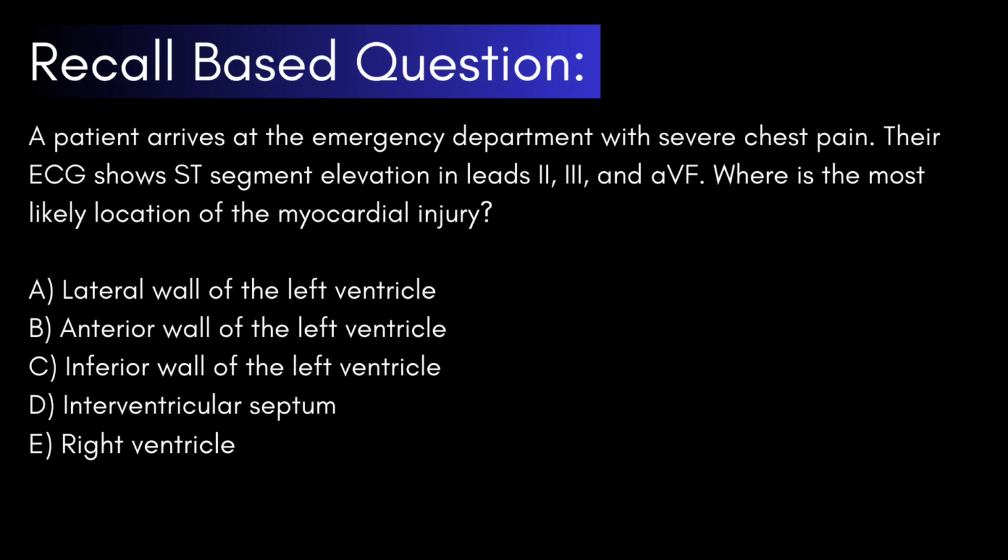A patient arrives at the emergency department with severe chest pain. Their ECG shows ST segment elevation in leads 2, 3, and AVF. Where's the most likely location of the myocardial injury?